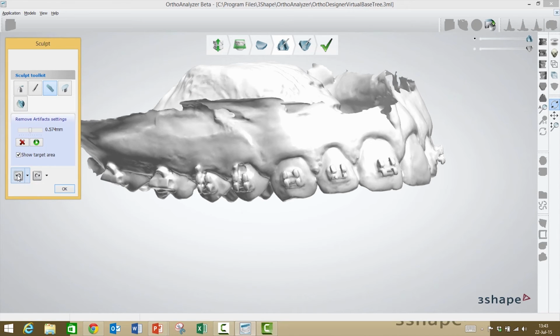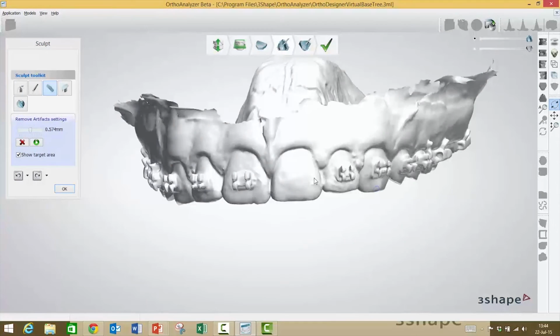Okay. So what do you recommend? So I recommend one to three brackets at a time, so you don't have to do the whole procedure again if you debonded it at one time.